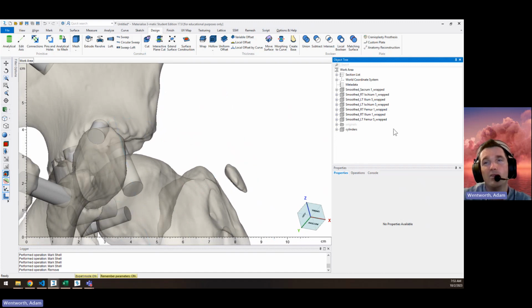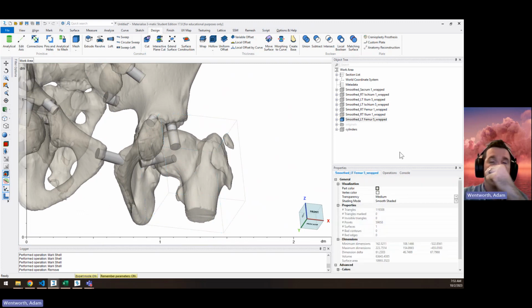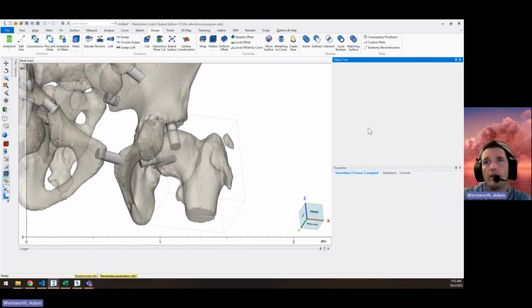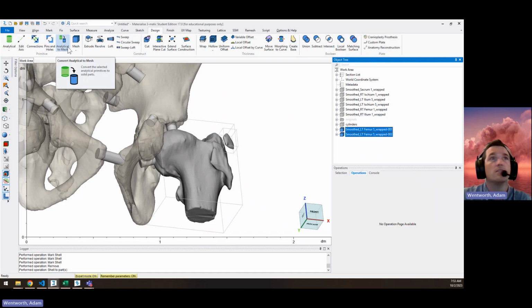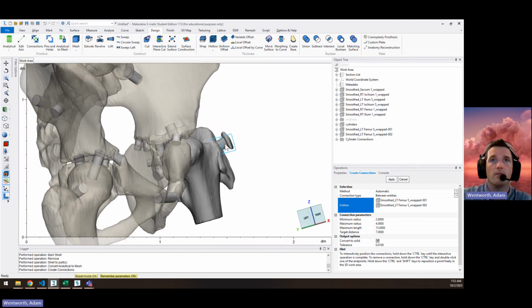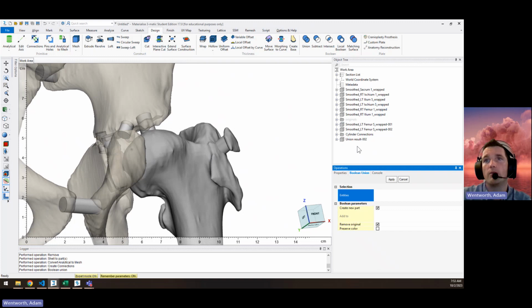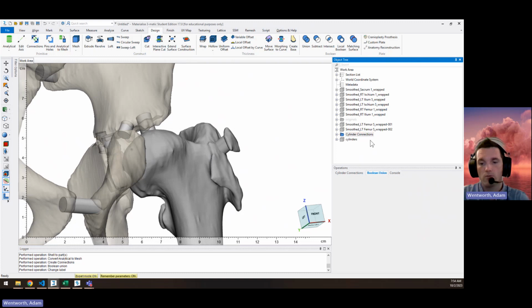One thing we might want to do in that sense is, this is all the left femur, but you'll notice if we do separate shells to parts, now we'll put that part that is not connected into a separate part. The piece of the left femur that's floating, so we can do connections between just those two parts as well. And then it will connect it. So we can again Boolean all the cylinders together, do the same thing, just have one part that's all cylinders.